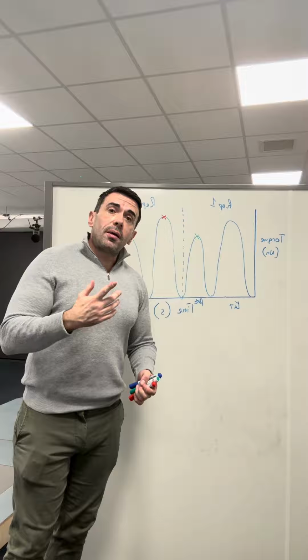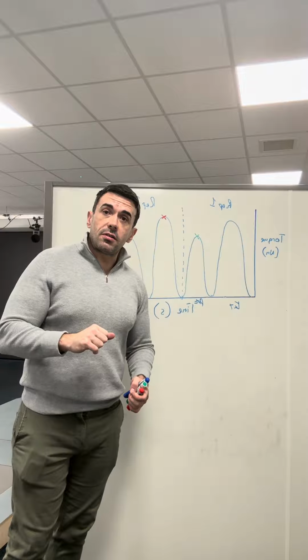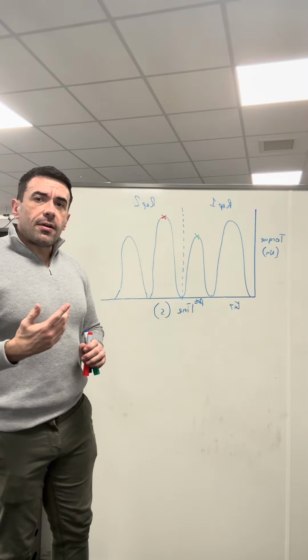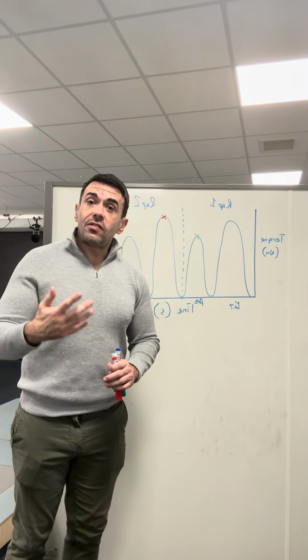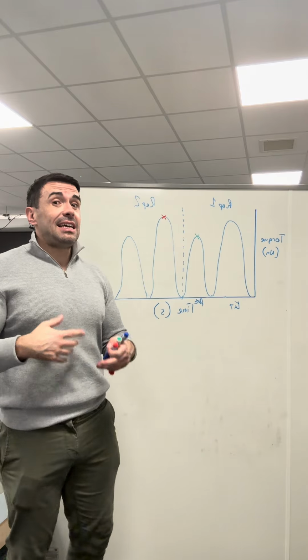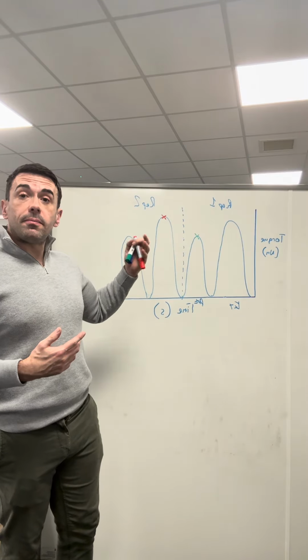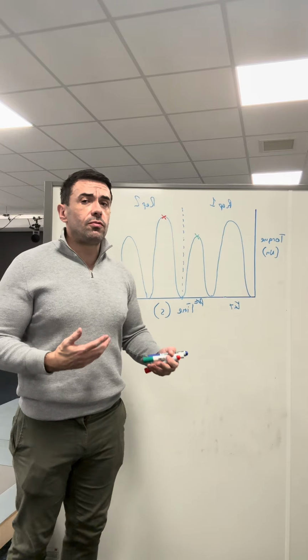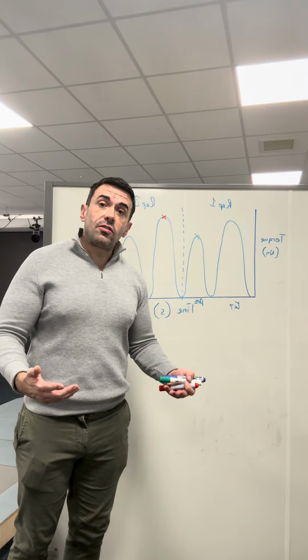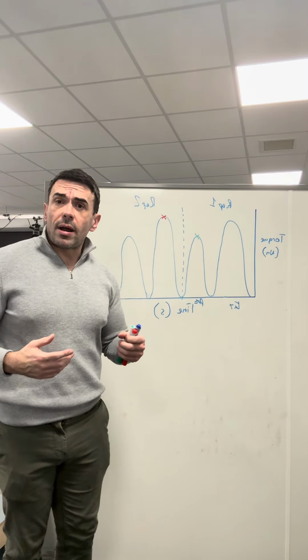So it's also worth comparing peak torque, which is the first measurement that you'll see at the top of an isokinetic report after the number of repetitions and the test information, with average peak torque to see if the deficit is the same. If there's a large deficit in peak torque that isn't present in average peak torque, it is perhaps best to assume that that deficit isn't truly representative of that athlete or participant's performance, because it is perhaps just an outlier. Maybe they just tried a bit harder on that repetition, maybe you didn't tighten the straps up properly.